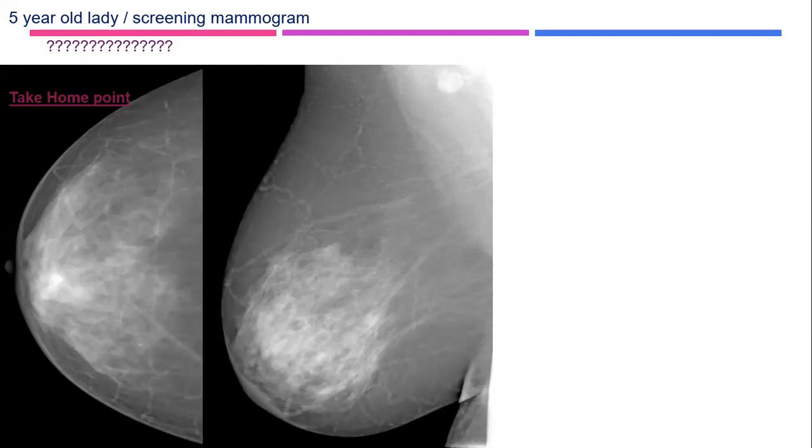It is a screening, so is it positive or negative? It is positive. There is diffuse mild anterior skin thickening. The left breast demonstrates the same skin thickening.